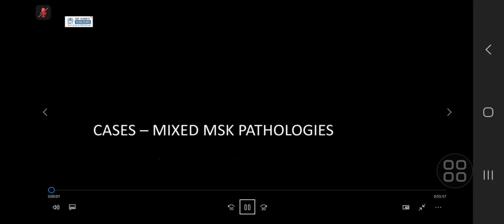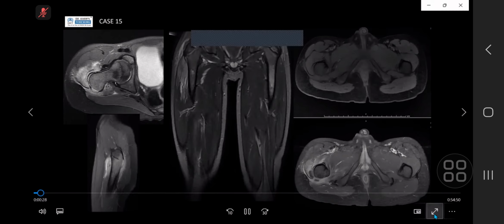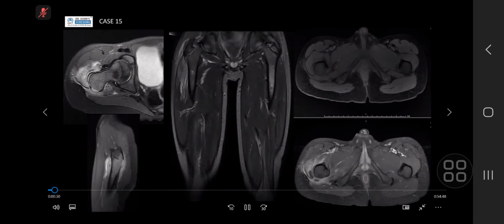Okay, so the next part is slightly different. It's really a mixed bag of MSK pathologies, things that I think as pediatric people in terms of MSK, we see quite frequently. So the more common things with a few less common ones, but they all have a point to make for this, which is why they're included. So I've got candidates 3 and 4. Let's stick with candidate 3 first for the first 7 cases, and then candidate 4 for the next 8 cases.